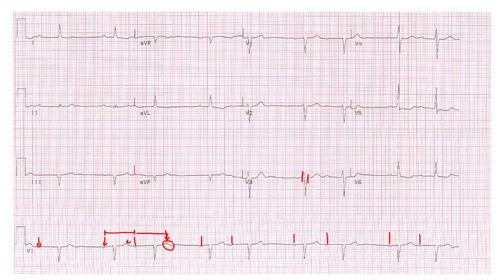Okay, so then I bet I have a P wave buried in that T, and I have a P wave buried in this T, and a P wave buried in this T and this T. Okay.